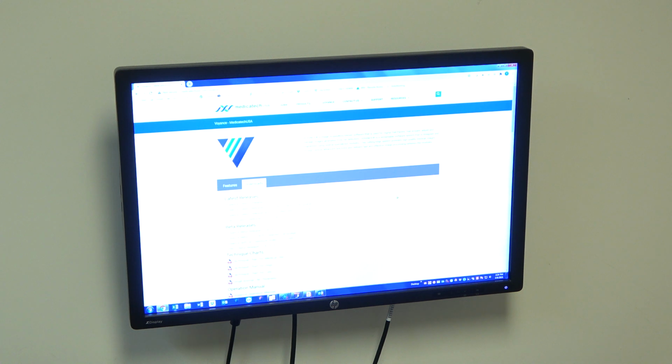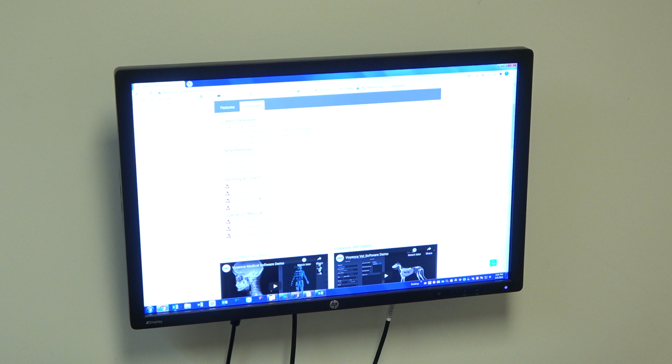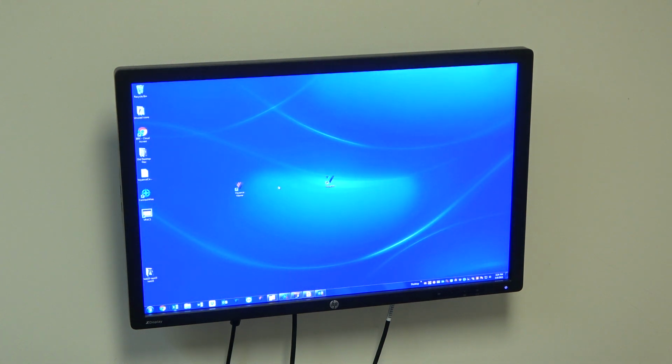On their website, they've got a couple of videos that are pretty helpful. They've got technique charts. They've got a user manual and everything else on it, which are all pretty good features. When you download the version, we save a copy of that version and put it in their folder so that we know which version they're running, and it also indicates on there.